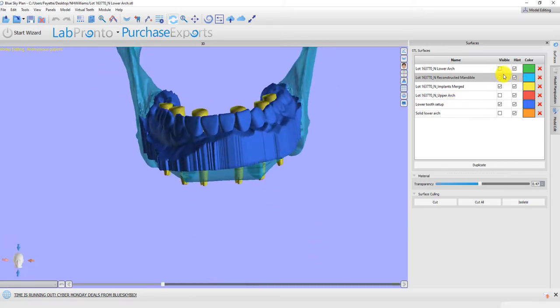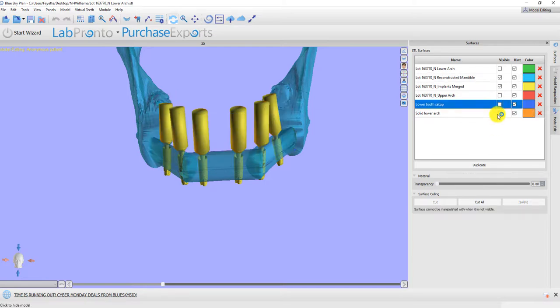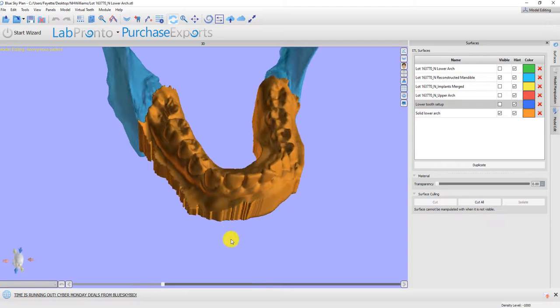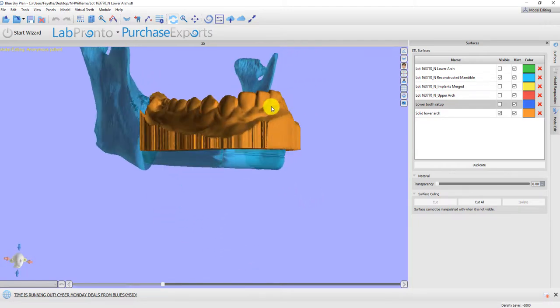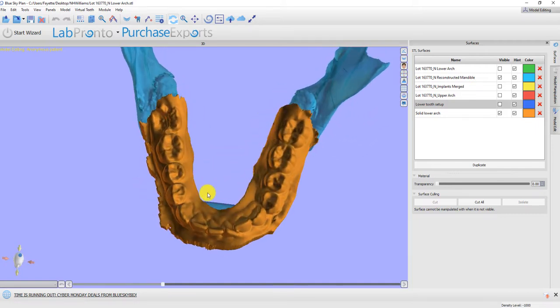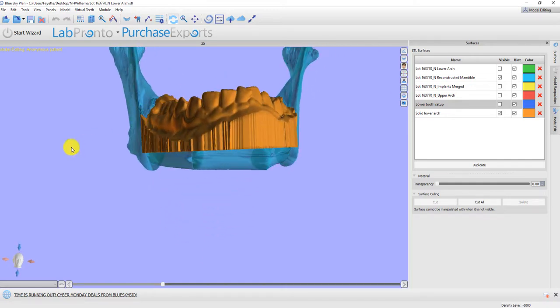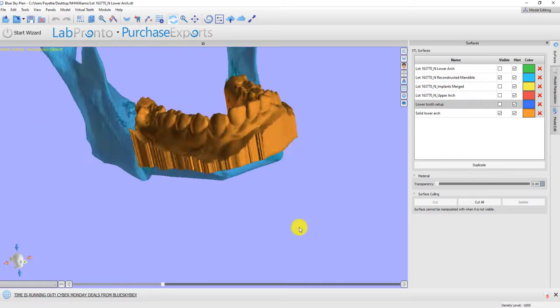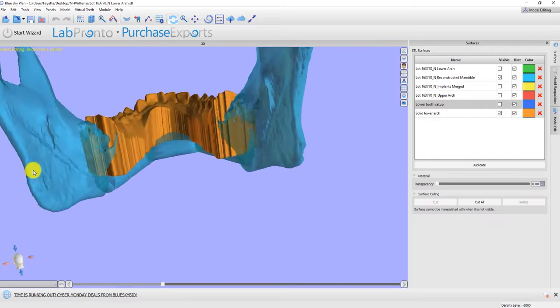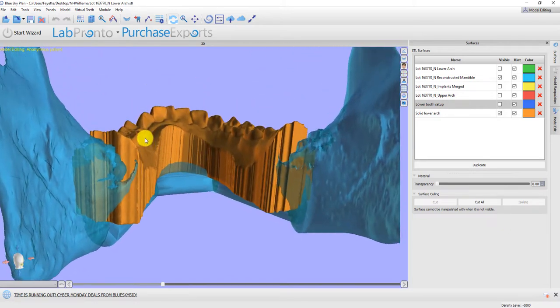And now, one thing I'm going to back up to show is the original teeth. Here we go. This patient has a tumor that's moving the teeth around and creating a malocclusion. And so normally I like to simply clone the existing teeth to make the prosthesis. But in this case, we actually cut these teeth out and made this. And I did this before the virtual surgical planning, so that we could plan the position of the implants.